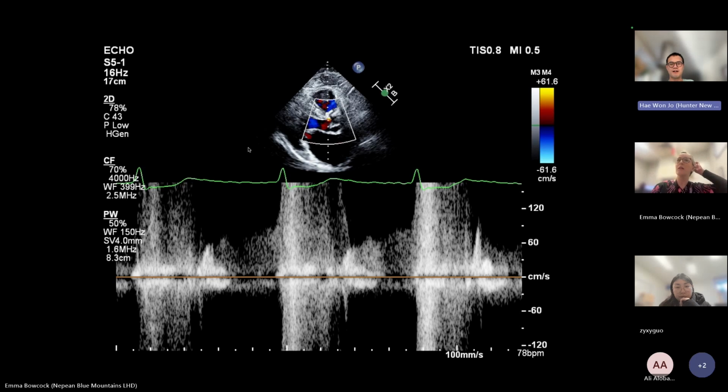No one wants to have a go. What are we looking at? What type of Doppler? So that's a pulse wave Doppler. No, that's a continuous wave Doppler. Pulse wave, yeah. That's pulse wave, right. Is it? Yeah. Okay.